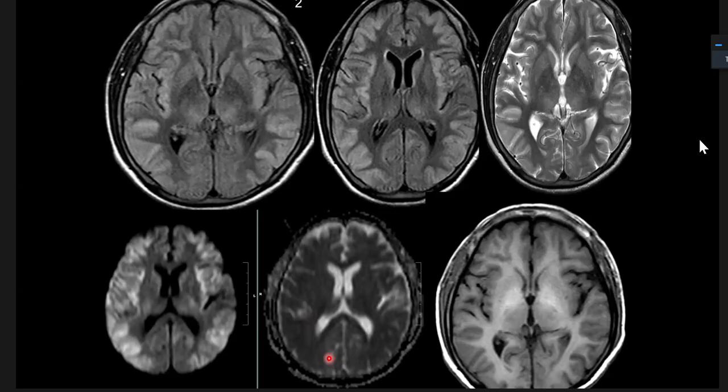In HIE, mostly posterior lobes and deep gray matter are more involved, sir. Deep gray matter. Excellent, very good. So right now, posterior lobes look spared. Okay, spared, sir. That is negative for HIE. Okay, but still can be HIE. Very good. Excellent point. HIE is one point, correct. So next DD, tell me. Anything in the image that is giving a clue?